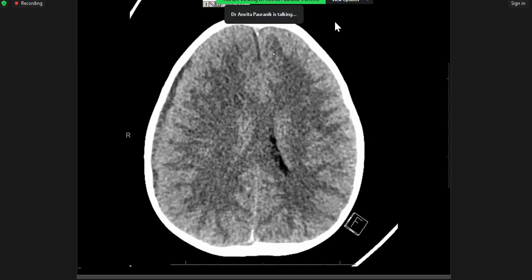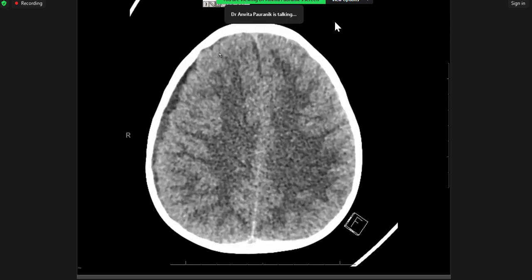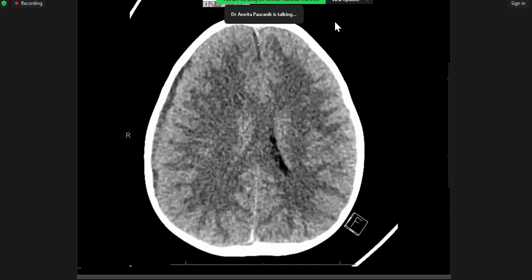And just close to it, what structure lies? This thing here, what is this? If we're just talking about these structures, what is this triangle here? That's the superior sagittal sinus, okay? That triangle. Julie, you have asked a very good question in chat, so we'll come back to it. So there is this little triangle of high density, which is the location of the superior sagittal sinus.